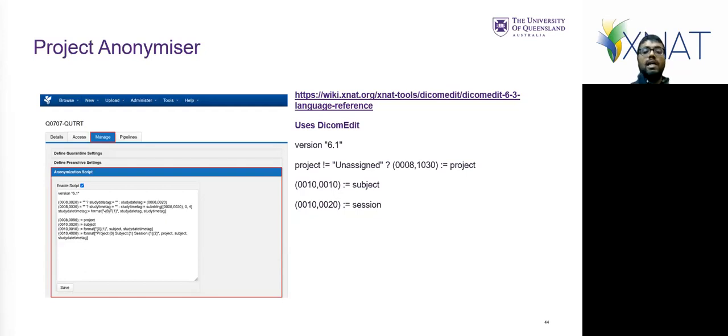They can use the pre-archive to assign a project once they've identified where it was supposed to go. An example of that, just for everybody: if your XNAT code is QUT-RT and it's mistyped as QUT_RT, that is not a recognized project, and it will go to the pre-archive as an unknown project.